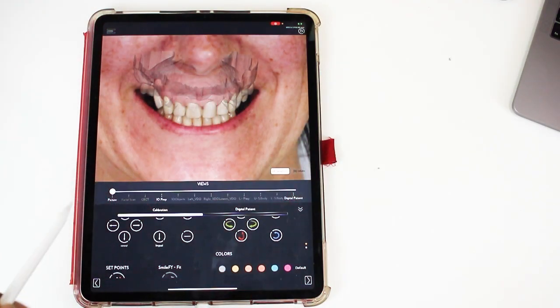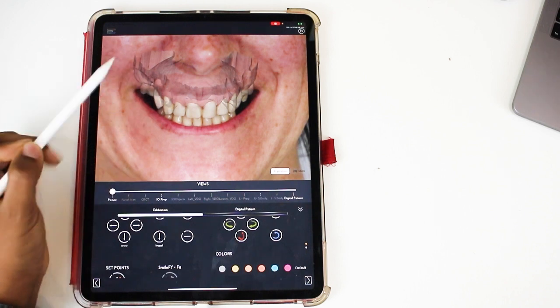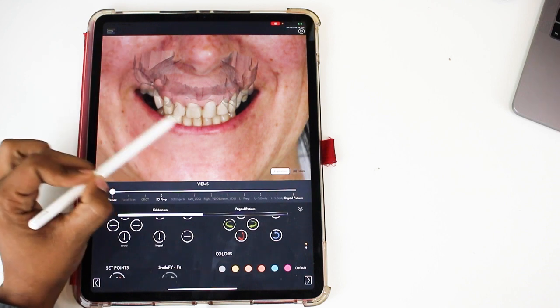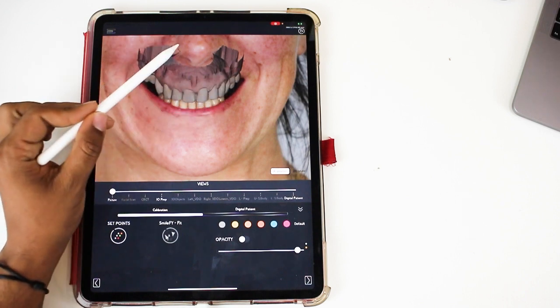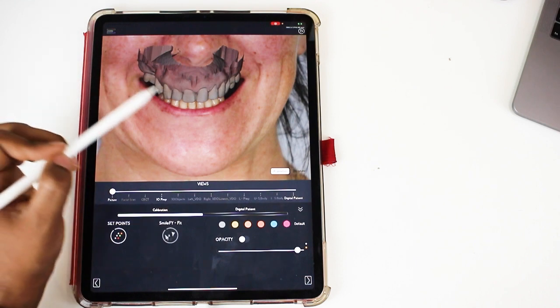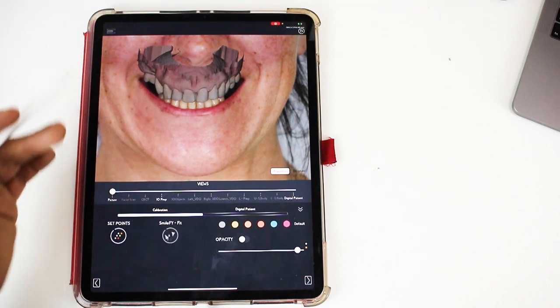To initiate your 3D design, the first thing that you have to do is to upload these files, such as the photo, upper and lower, into oral scan, and then merge them together. The benefits of creating a 3D design using SmileFy is that instead of creating a wax-up without having facial references, you design and do your facial analysis all together.